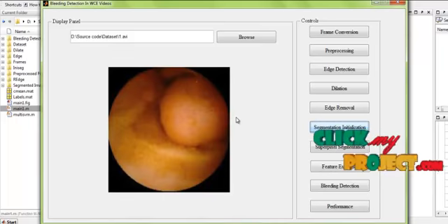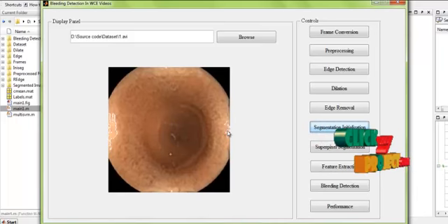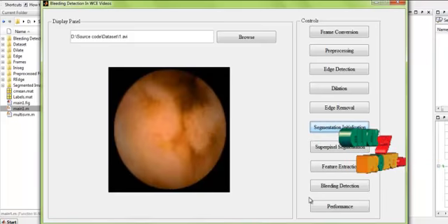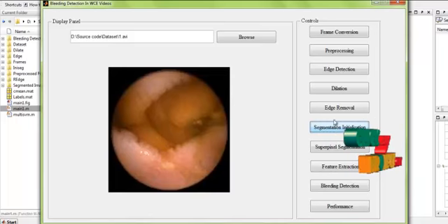Hence the regions to be searched in the overall video are reduced using this process. The white regions were matched with them and superimposed over the input video sequences, so that we can identify the needed portions in the video frames. This process will take some time for execution.